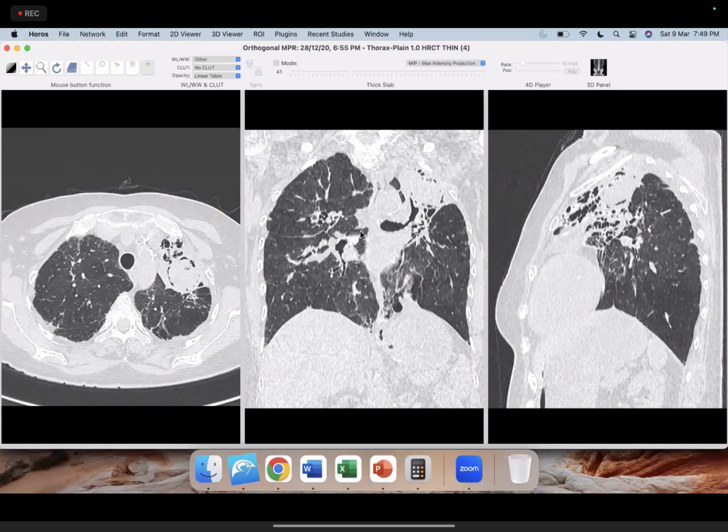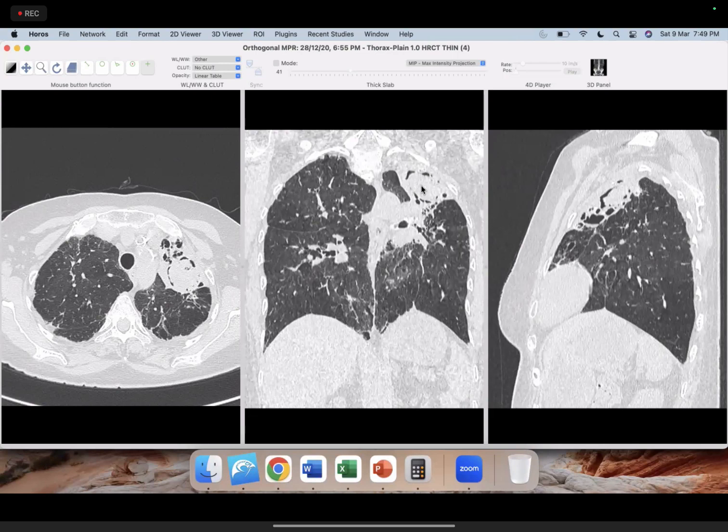So many are saying aspergilloma, fungal ball. So again, terminology. What would be the right terminology? If I tell you this patient is symptomatic for 3 months, actually this is what we'll call a chronic cavitary pulmonary aspergillosis or CCPA, right?